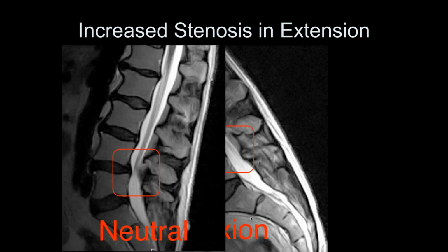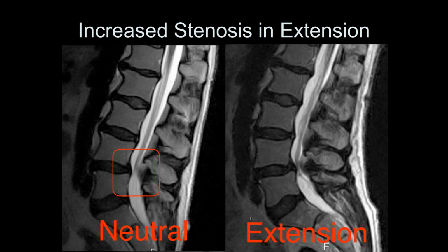And here's a case where it's severe central stenosis really in all three positions. And then example, and then here the extended. So this was the most severe case that we saw, where we got much more severe central stenosis in the extended position. But the bottom line is the vast majority, over 90%, had no significant change between the different positioning and the supine position.